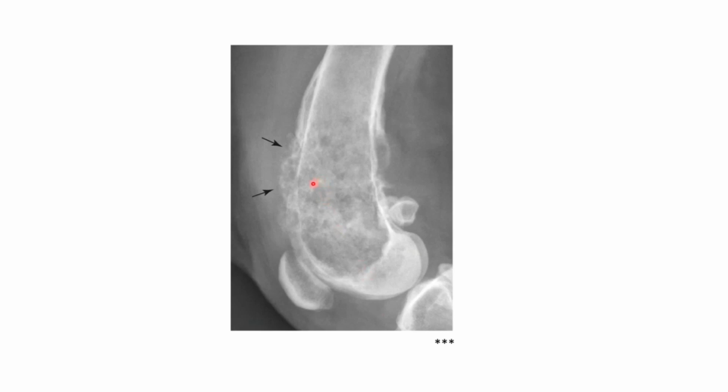There are numerous areas of bone lysis and lucency that are coalescing, so we could describe this as a permeative lysis. We certainly have some evidence of cortical destruction. The margins of the cranial and the caudal cortex are somewhat effaced, and there are areas where we're losing the density of that cortex.